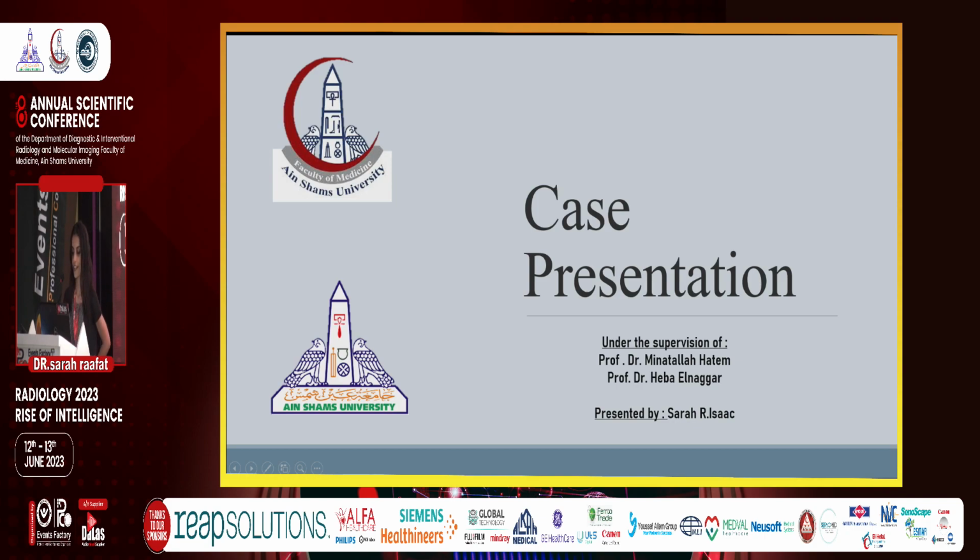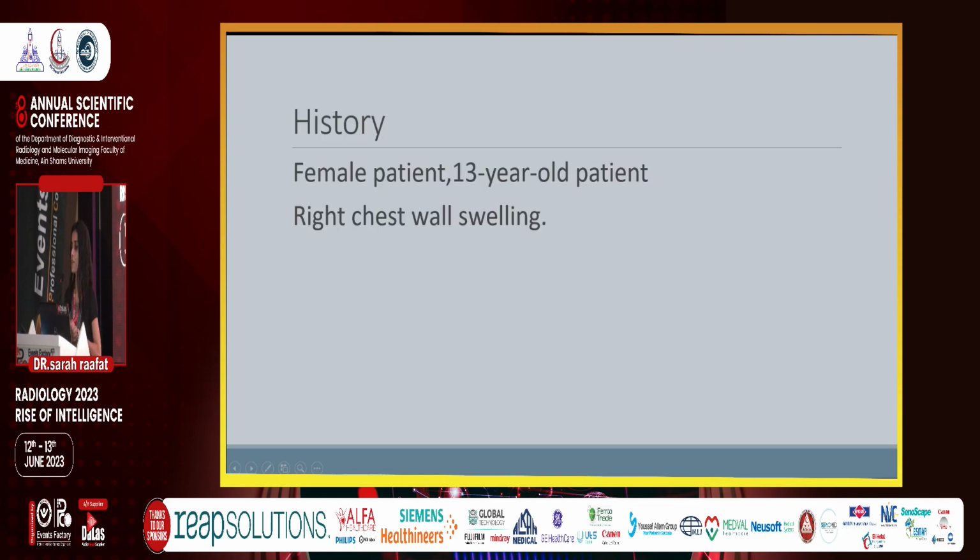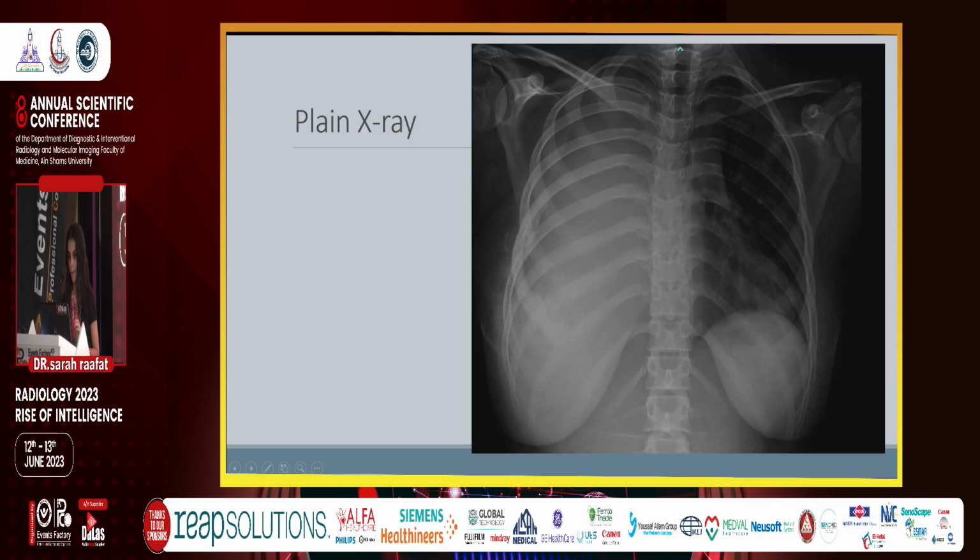This is our case presentation for the molecular imaging. Our case is of a 13-year-old female patient who presented to us with right-sided chest wall swelling with respiratory distress. Now, first things first, the clinician ordered an X-ray.